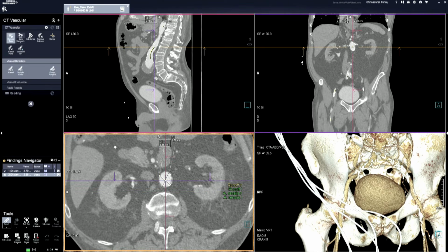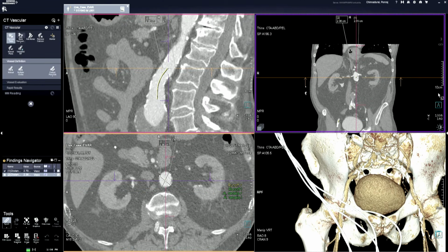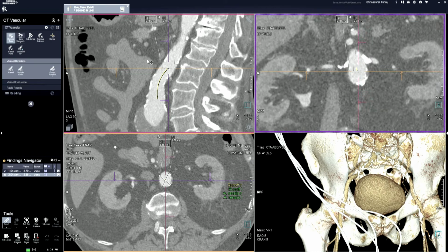So if I bring back my cursor, let's go back here. The slice we are measuring here: these windows are color-coded for a reason. You see the bottom left window is orange outlined. What you are seeing here is right where this orange line is.